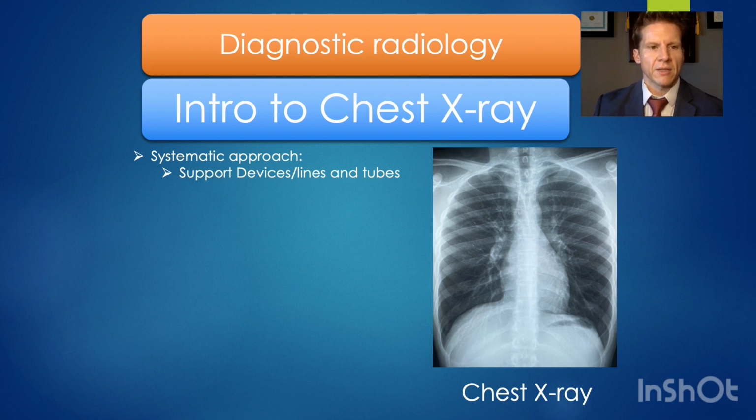Now, the next thing that we want to look at when you start looking at the chest is any support lines and tubes, any extraneous devices or metal that the patient might have. So if they're intubated, if they have a nasogastric tube, chest tube, central lines, all those sorts of things, sometimes they can be subtle, and if you don't specifically look at them, they can be easily overlooked. Or if you don't identify the positioning of them, they could be malpositioned and you might miss it pretty easily. We'll go over in detail in another lecture the specific positioning of all the different support lines and tubes.